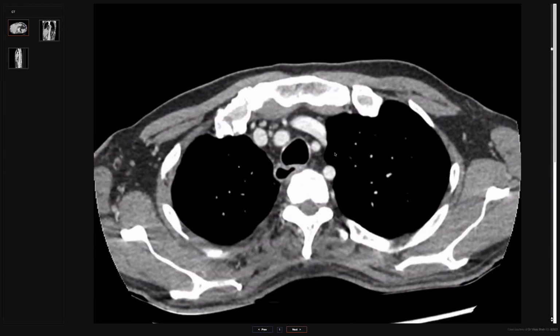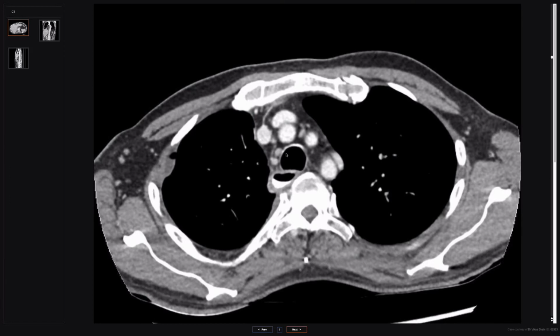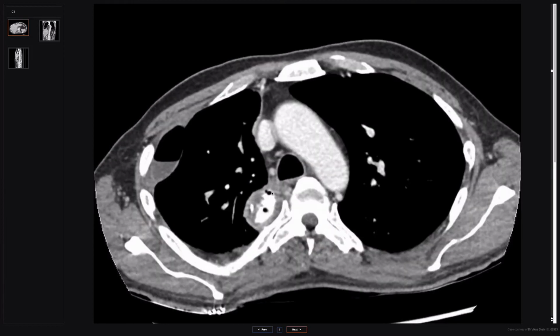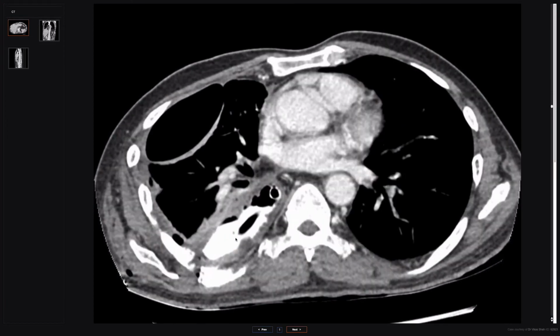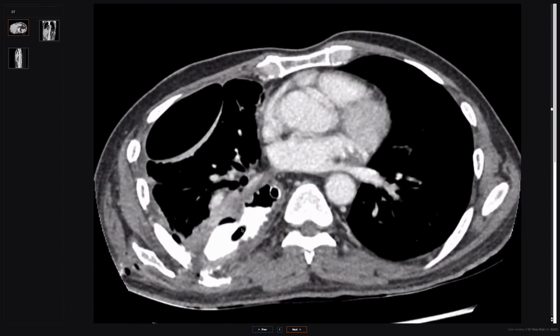Okay, so I've not shown you some of the other previous images before this. So we've got the trachea, and then behind that, this is the pull-up, and the density within it is the contrast. And as we scroll down, then from the back here, there is a leak, and this is a tube that's running out from outside of the body through the hole that they've got.